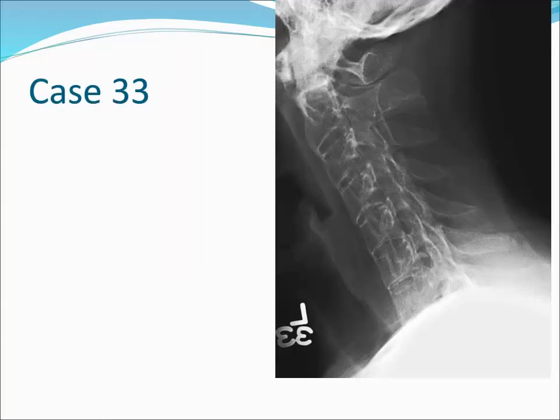Lateral radiograph of the cervical spine demonstrates complete ankylosis of the spine, as well as solid bone fusion of the facet joints, arrowheads. Ankylosing spondylitis often results in extensive ankylosis of the disc spaces, facet joints, and posterior elements, resulting in a bamboo spine appearance. The thin, marginal syndesmophytes present in this case are typical of patients with ankylosing spondylitis and inflammatory bowel disease, as opposed to the large, bulky, non-marginal syndesmophytes seen with psoriatic arthritis and reactive arthritis.